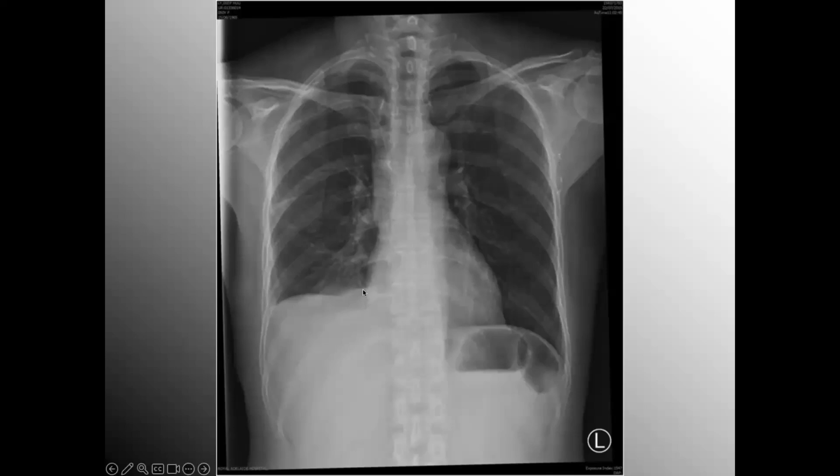The cardiac, I can see the right anterior border clearly delineated, and on the left, notice it's very obvious the left anterior cardiac border is more traceable down to the diaphragm than it would be here. So I definitely have volume loss on this side, and I have a little bit of compensatory hyperinflation. And you say, well, there's not significant hyperinflation because it's not hyperlucent, but what I have is an increase in rib spacing. Look at this side versus this side, much wider.